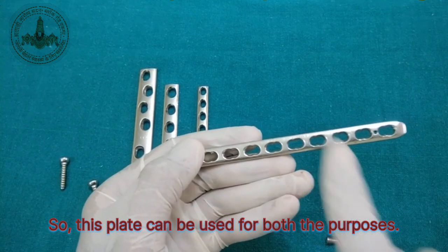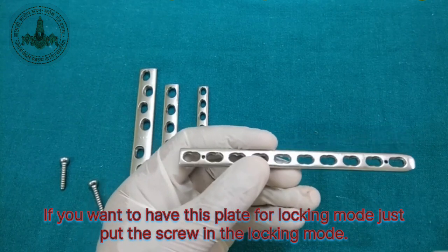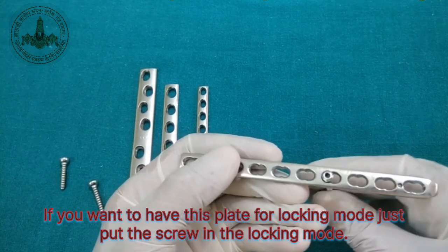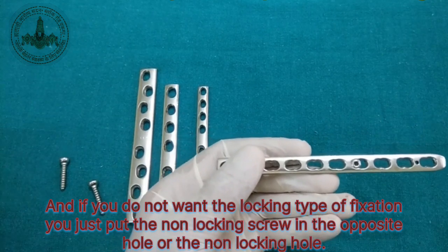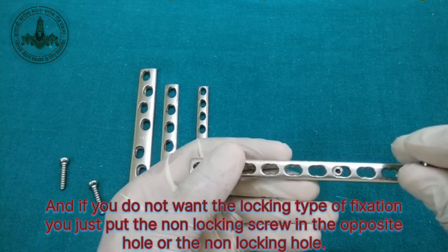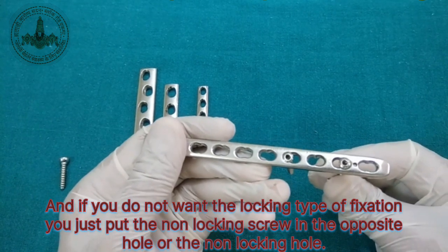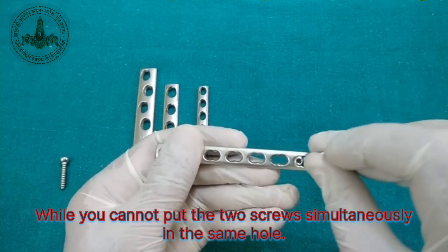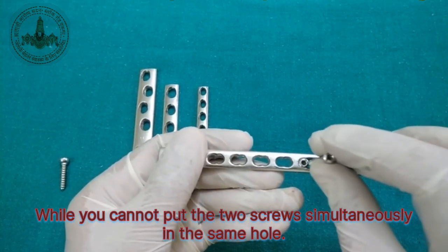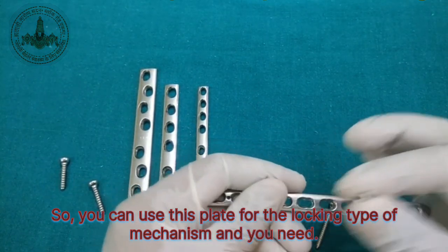So this plate can be used for both purposes. If you want to use this plate in locking mode, just put the locking screw in the locking hole. And if you do not want the locking type of fixation, you just put the non-locking screw in the opposite hole, the non-locking hole. So this is the basic mechanism, though you cannot put two screws simultaneously in the same hole. So you can use this plate for the locking mechanism when you need.